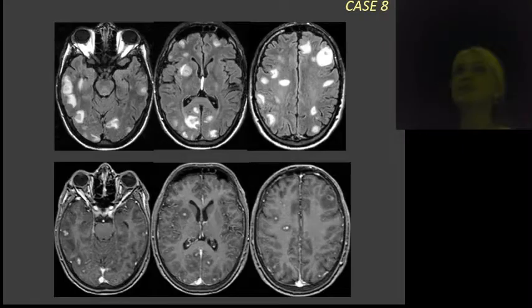Okay. This is an HIV positive patient, another case, and there are several lesions. First you look at this, and you go like, oh my God, what is this going to be? And then you count down, and then you go back. Which sequence do you go back to first, if you have it? You go back to T2, very primitive T2. I don't have T2, I have FLAIR. And now you look. This is all enhancing, but when you look at the lesion itself, they're usually dark. All this bright is edema. The lesion itself, the part that is enhancing, is dark on FLAIR.